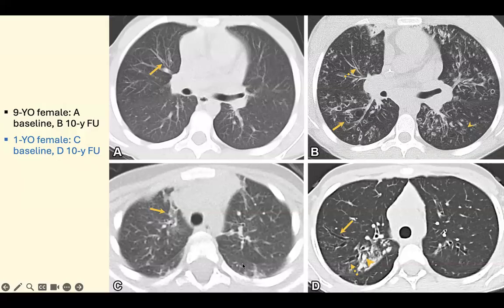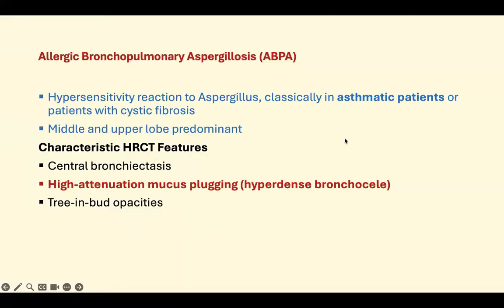The patient was going on and off with repeated recurrent infections in the upper lobes, specifically with ground glass opacities and reticulations or parenchymal bands involving the upper lobes. This passed unnoticed to alarm for cystic fibrosis. At least do not miss diagnosing cystic fibrosis at this stage radiologically.